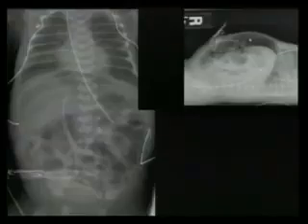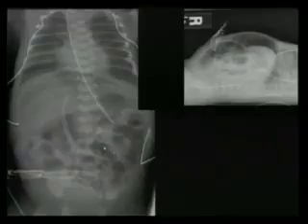You see the inside wall and you see the outside bowel wall. You could measure the bowel wall thickness. You should never be able to measure the bowel wall thickness. Be careful. Don't call this double wall sign because these are just two bowel segments laying beside each other. But this is the double wall sign.